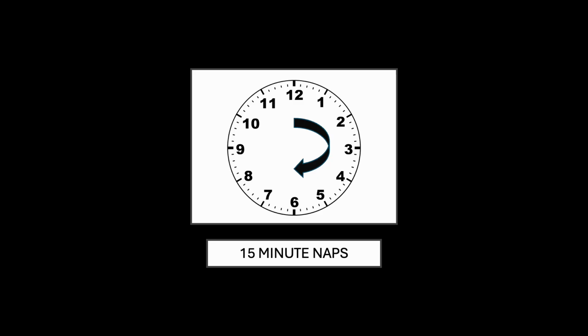It's going clockwise. Now, if we sample at half the frequency, so the frequency at which it goes around is 60 minutes, and we start taking 30-minute naps, that's where things get a little confusing. We go from the 12, and then we look and see the 6, and then we look and see the 12. If we've never seen a clock before, we don't have any understanding of the direction. It doesn't look like it's moving in a particular direction.